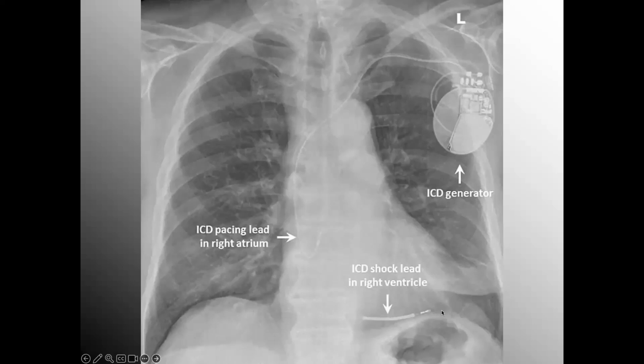The reason I don't think it's fluid, and I think it may be something more like what we say is plate atelectasis, more of a linear collapse, is because this does not have a fluid density. Fluid density, the easiest way to compare it on a patient is what does their heart look like, because it is filled with fluid, it's filled with blood. And here we still have some pretty decent aeration. So that's probably more of a linear plate-like atelectasis, sort of a collapse in a general area.